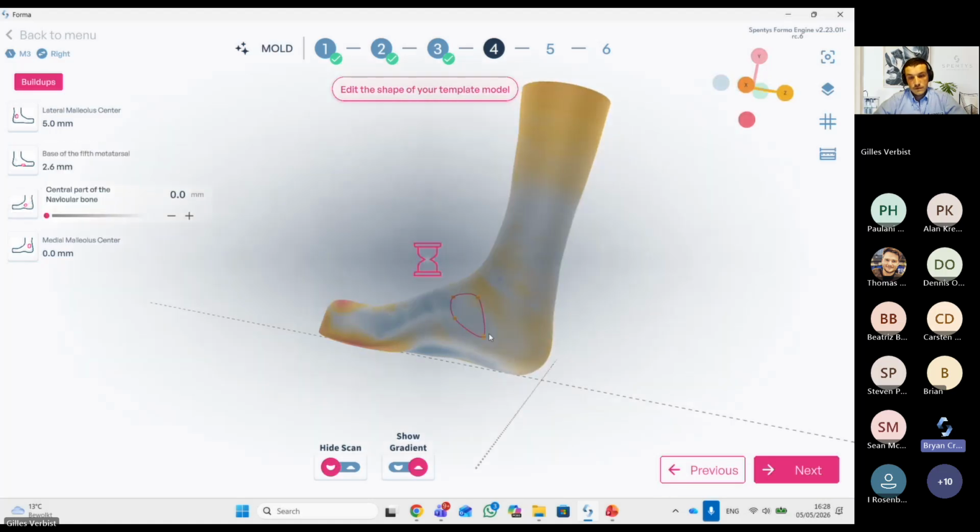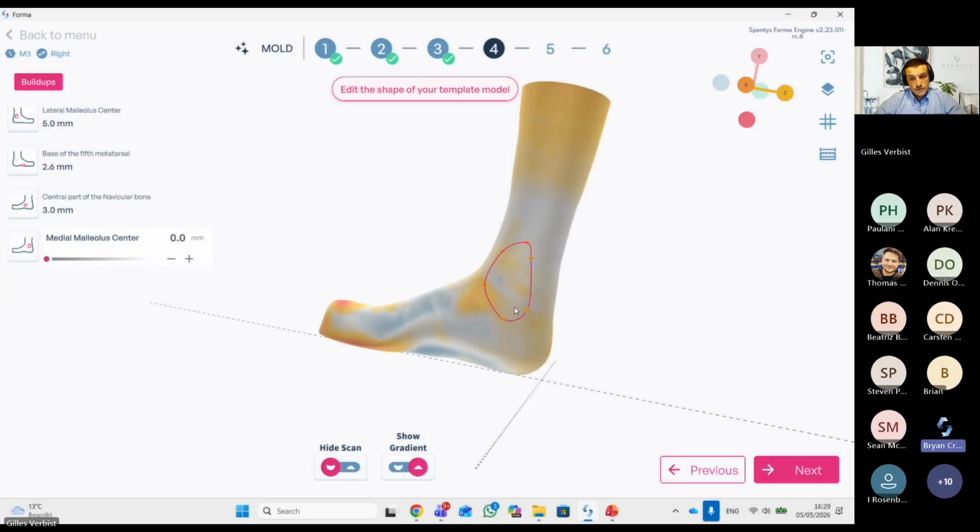If you had those specifications and wanted your own custom mold to where your buildups populate on your mold, that's a service that we provide, and it allows you to go even faster here. So instead of having to adjust the shapes and the specific buildup amount, when you arrive to this step, it could automatically apply in those locations and amounts. So just want to call that part out, that we could truly customize the software for you as well if your volume justifies it.